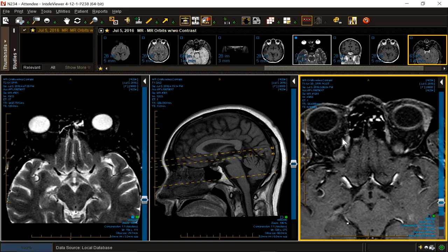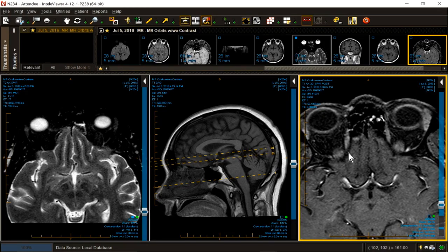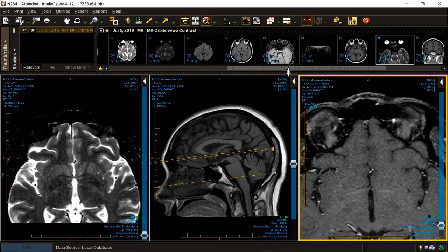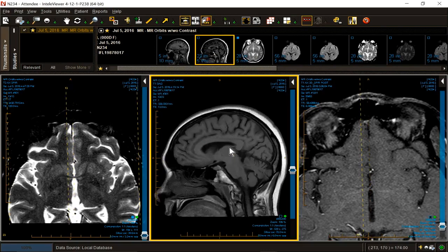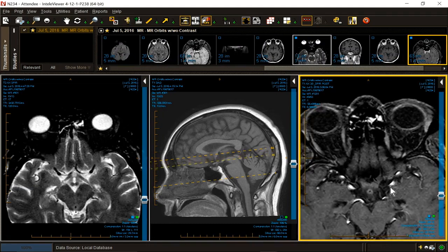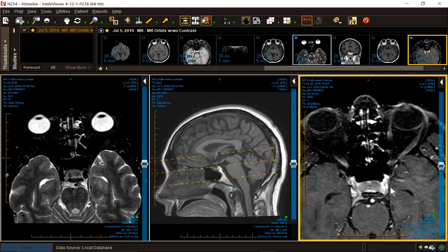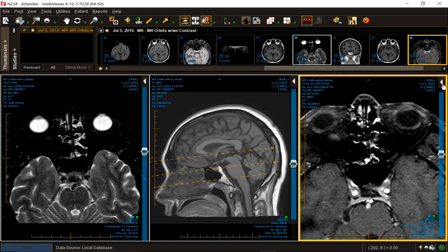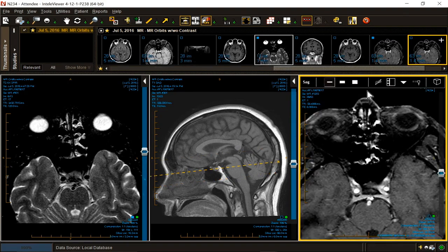An aneurysm off of? Couldn't hear you. Let's see. On the sagittal or on the axial? Got it. Let's see if we can reconstruct it. I will tell you it wasn't commented on. Read by an excellent radiologist, by the way. Let's reconstruct it.